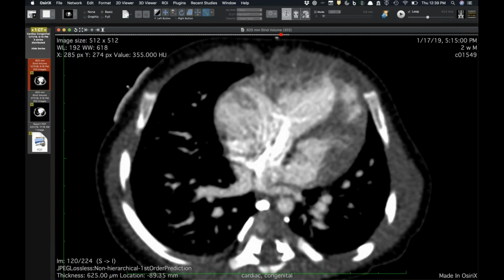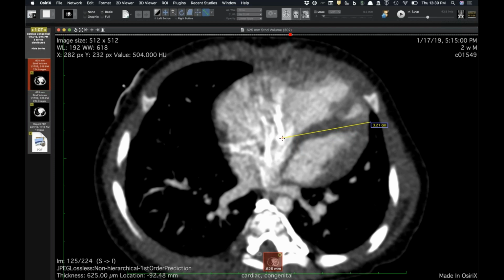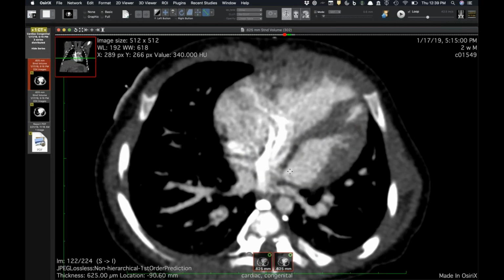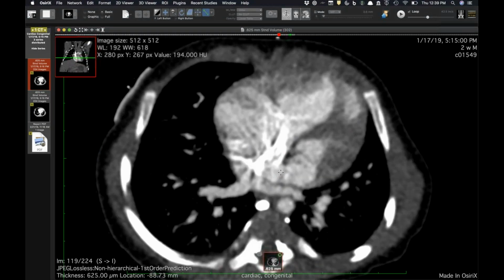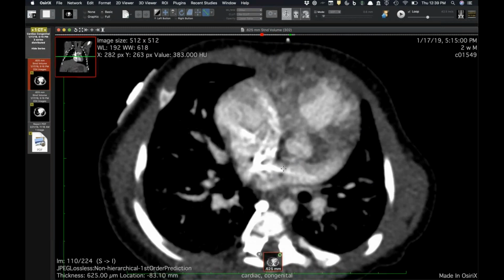When we were discussing this in the preoperative conference, there is a small, well, not small, but there is a patent foramen ovale. But if you look at the axis of the ventricle, the axis of his heart should be like this. The surgeon was commenting that it looks almost like the axis of the atrial septum has deviated and migrated leftward. And so you're essentially getting a total anomalous pulmonary venous return from this weird placement of the interatrial septum.